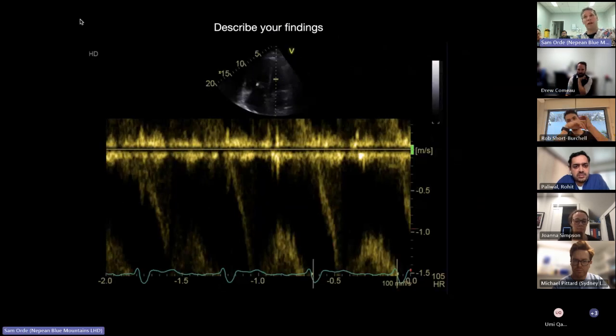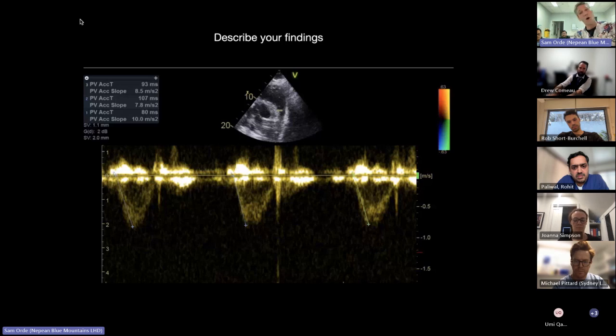If you're looking at a dodgy image, and we're trying not to give you too many of these, to be honest, we're trying to keep the imaging okay. But for example, on this one, if you don't see a closing click, you might want to mention that. That's a good one to talk about. You can talk about the image optimization could maybe be a little bit better. Normally the point and shoots are about pathology. But we might specifically give you a really bad one, like we've done once before with ghosting artifacts in there, and say, could you critically appraise this image? You're more than welcome to bag out the pictures and talk about how you'd optimize them. But normally we'd direct you if that's what the whole question is about.